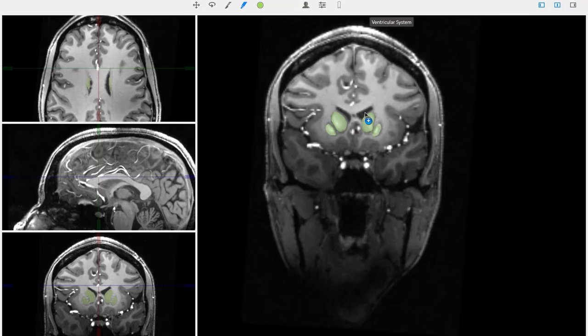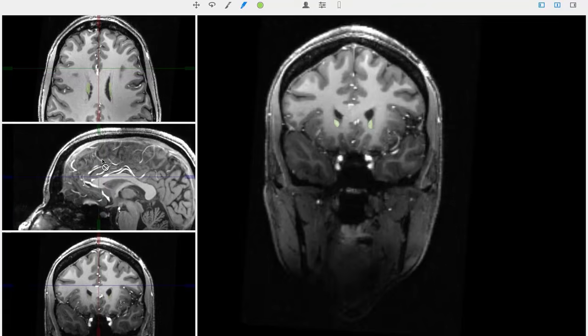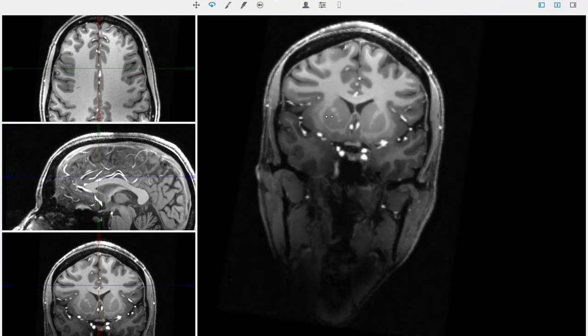They are lateral to lateral ventricles. So lateral ventricles, lateral to that is caudate. Then there's the internal capsule, white matter piercing the striatum, and then lateral to that is the putamen. Do we see globus pallidus here? No. We're far too rostral in the slice. As we go farther back, we will pick up the globus pallidus. So watch the caudate and the putamen as we move from rostral to caudal.